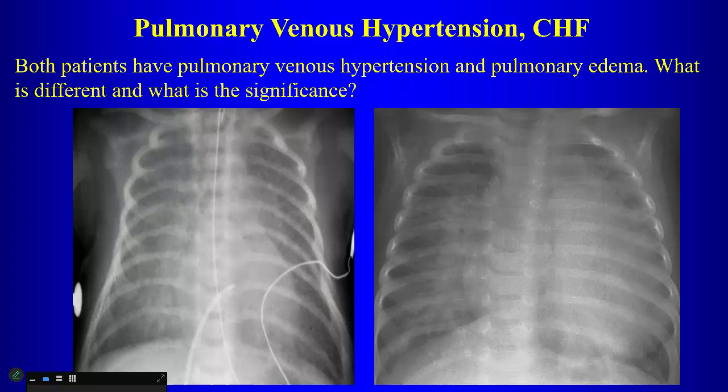This is Eisenmenger? No, this is not Eisenmenger. This is failure. And here we're talking about neonates, babies. So this has to do with if you have a congenital cardiac malformation, if the heart is normal in size, then there's an obstruction at or proximal to the mitral valve. If there's a congenital cardiac abnormality that leads to a big heart in failure, and if there's an obstruction, then the obstruction will be distal to the mitral valve, when the heart gets big.